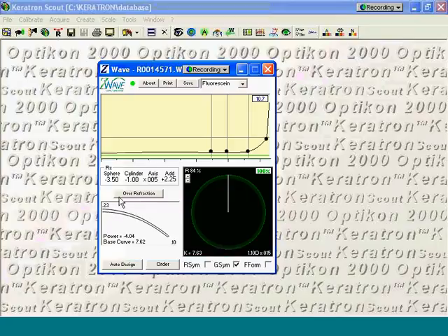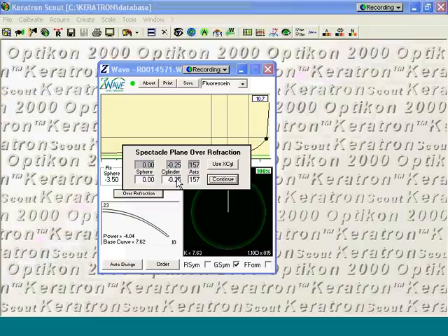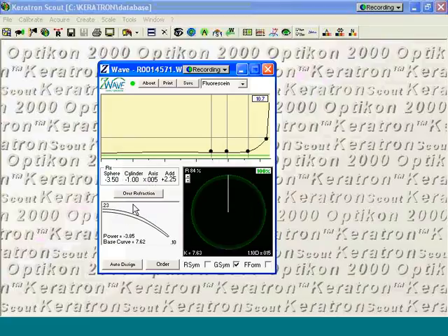With that in mind, I generally like to really reserve this for cases where I absolutely need that cylindrical over-refraction because it keeps my lens thickness possible to keep it down to a minimum, and we can get a little thinner profile for the lens. But this lower left corner is where you see how the lens thickness is distributed on the surface of the contact lens.